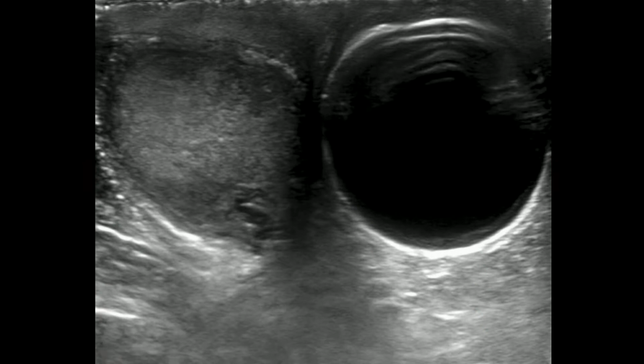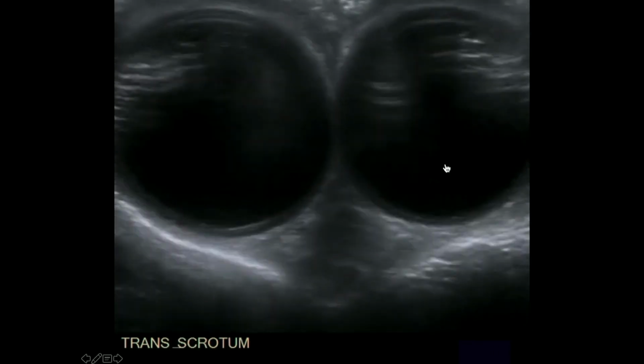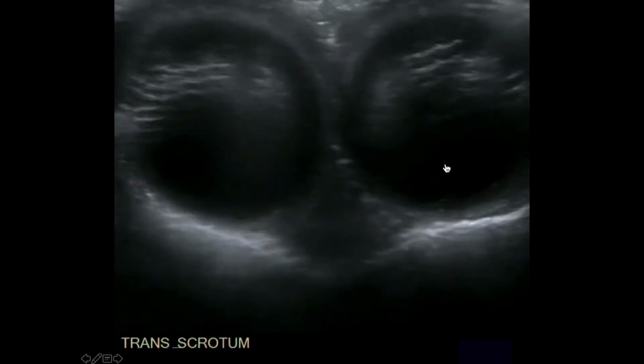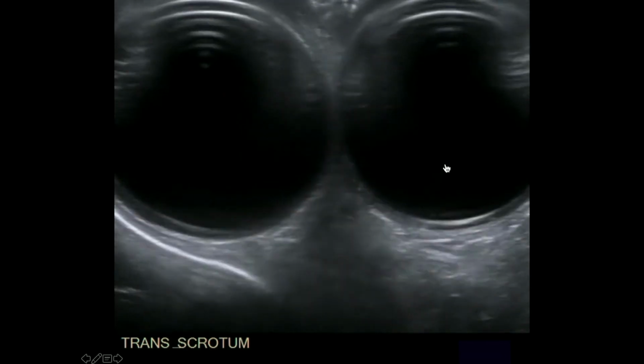This is a silicone prosthesis, just like we use for breast augmentation there. This guy had a testicular cancer, so this is a cosmetic product there. So that's what it looks like. We had this earlier this summer. Remember that one of the biggest risk factors for testicular cancer is having had testicular cancer on the other side. So this guy unfortunately had metachronous testicular cancer, got bilateral prostheses there.